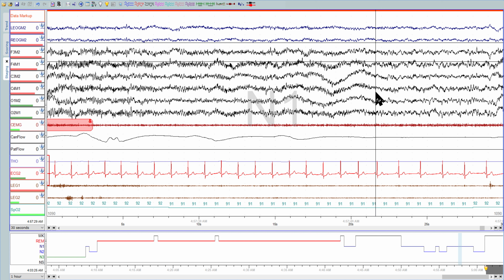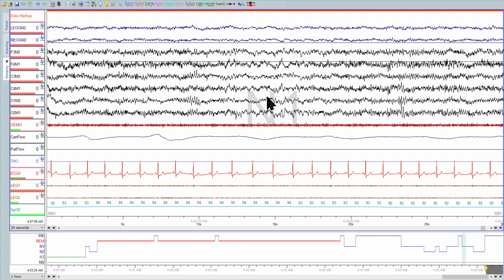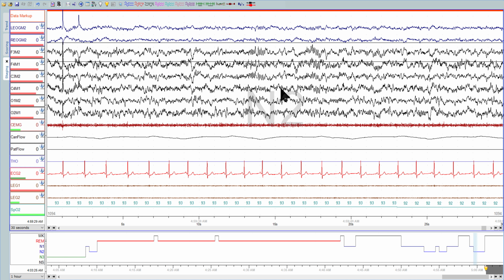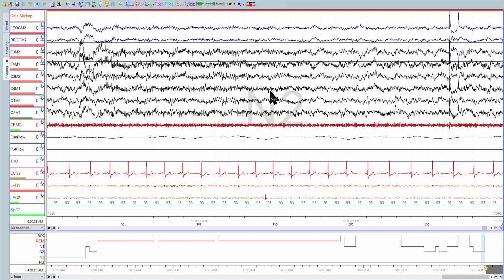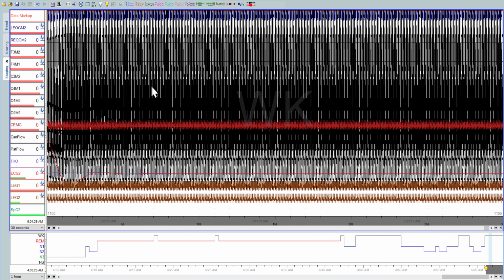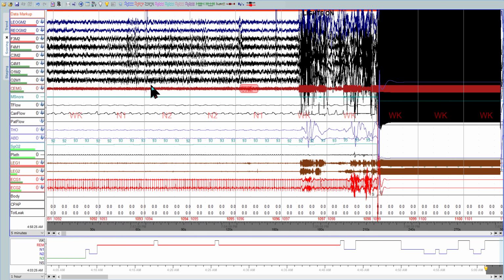This would be wake. The sleep happens towards the end here, if you can see that. Wake, wake, wake. And then one spindle, next one will be two. Two, good, you had it. Another arousal there that you missed. Changing this to stage one. And then lights on.